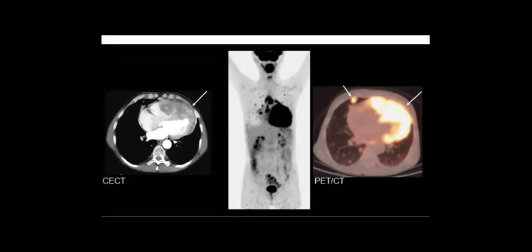Okay. So what do you find here if you try to describe what is going on? This patient has cardiac symptoms. Yeah, cardiac mass. Perfect. It could be a primary mass or a secondary mass, right? If it is primary, you will think about a primary cardiac tumor, especially with this very high uptake. So what will the primary cardiac tumor with very high uptake be?